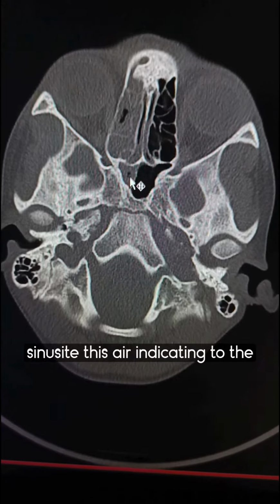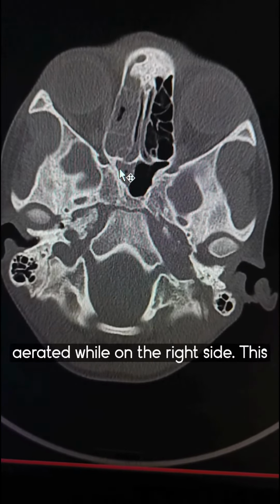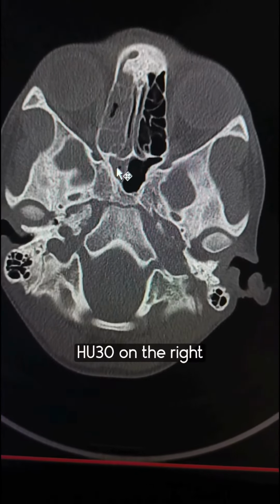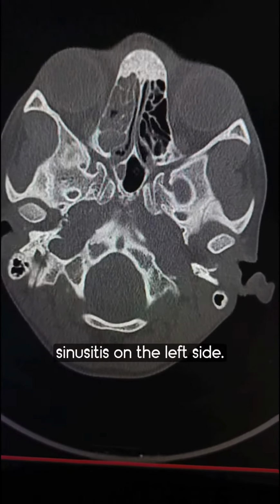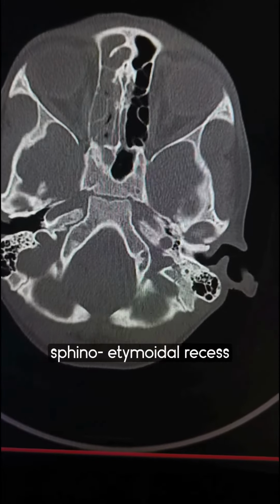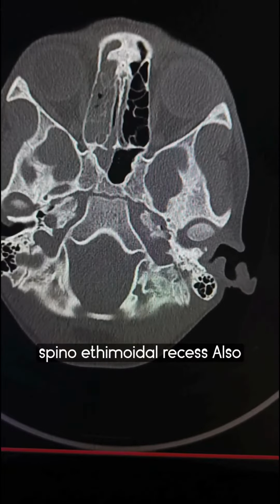This arrow is indicating the sphenoid sinus. On the left side it is well aerated, while on the right side there is mucosal thickening of HU 30, indicating sphenoid sinusitis. On the left side we can see a well-formed sphenoethmoidal recess, while on the right side there is obliteration of the sphenoethmoidal recess.